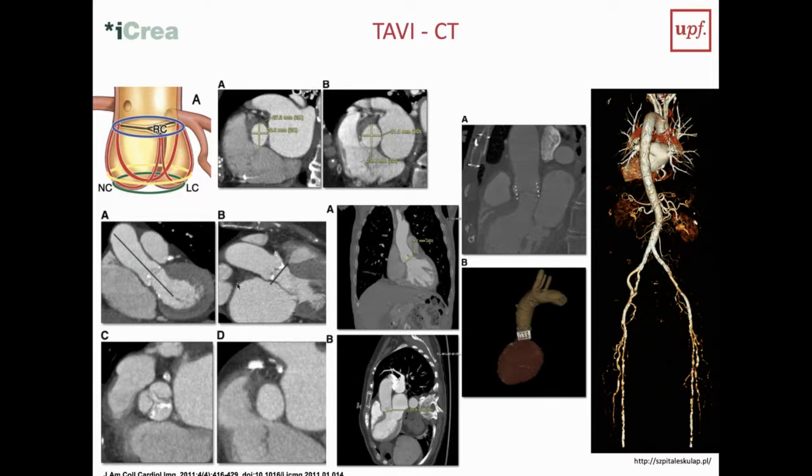Keep in mind, and also, as you can see here, you see these very bright things, so that there's quite some calcifications, because the reason why this valve is not functioning anymore is very often related to the remodeling of this valve, disease of this valve, which is actually very often calcifications. So if we need to put in a stent and then open this valve, if there's calcifications, we might have to break it, or that might actually cause rupture also, so that's important.